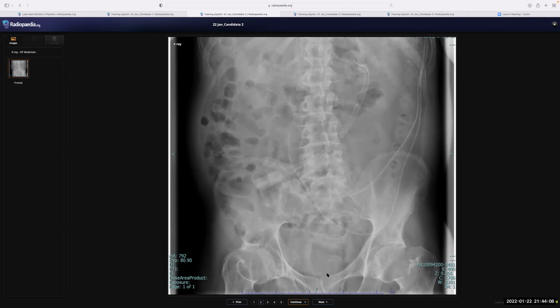So I'm now trying to look for any finding in this abdominal radiograph which can explain the reason for sepsis. I'm closely following all the bones to see if I can find any discrete lucency which could be a focus for osteomyelitis, a reason for sepsis. I do see a lucency in the right acetabulum. If it's not positional, then this would warrant further investigation. It could be part of septic arthritis or osteomyelitis, or even an aggressive lesion with a soft tissue component.